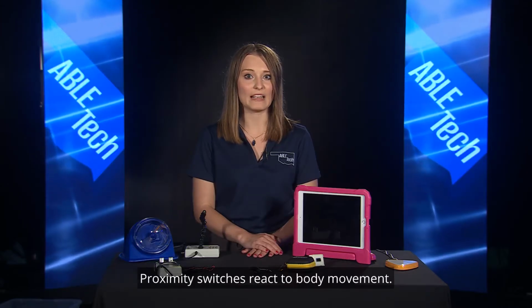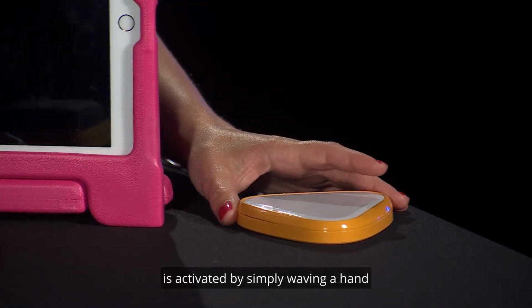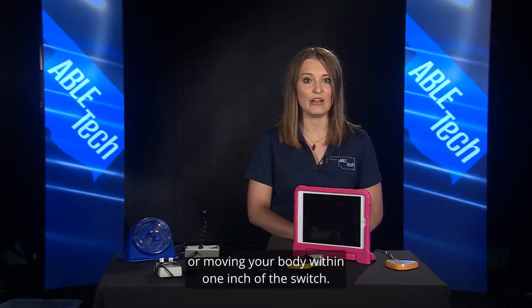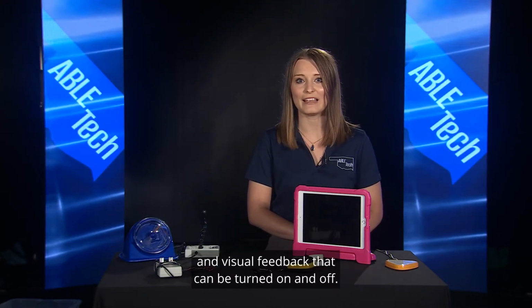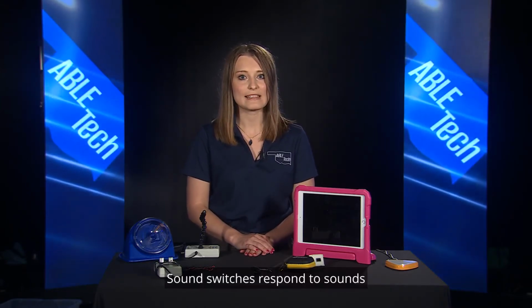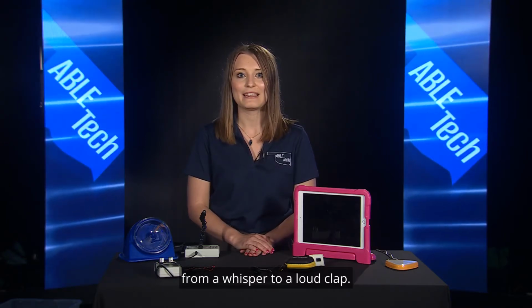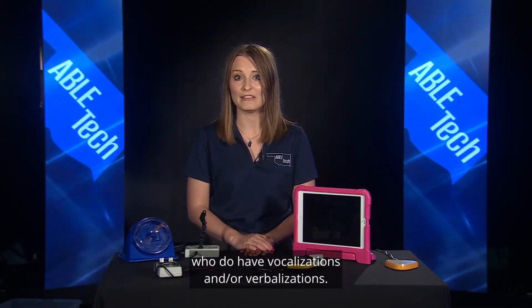Proximity switches react to body movement. The big candy corn switch is activated by simply waving a hand or moving your body within 1 inch of the switch. This switch features an auditory beep and visual feedback that can be turned on and off. Infrared and fiber optic switches use light rays to activate a device. Sound switches respond to sounds from a whisper to a loud clap. This is a great option for individuals who do have vocalizations and/or verbalizations.